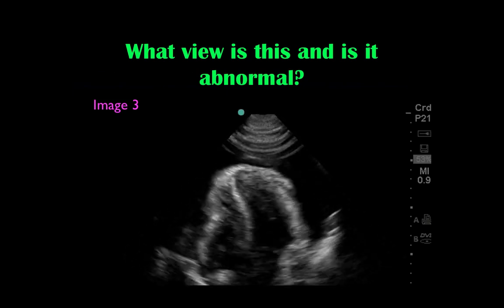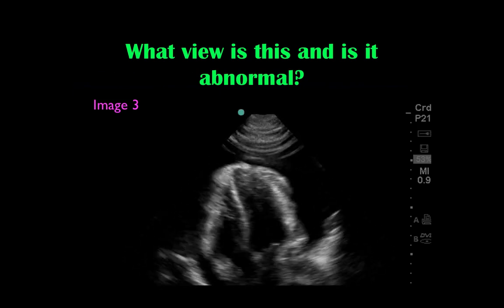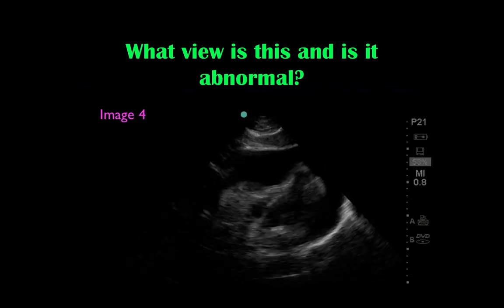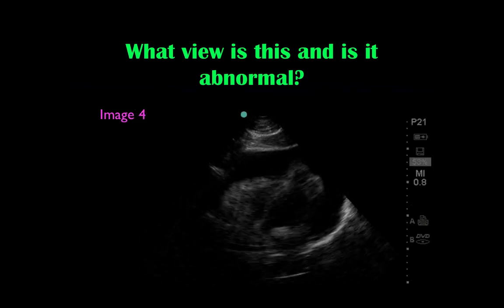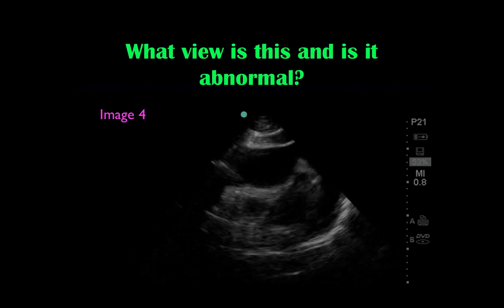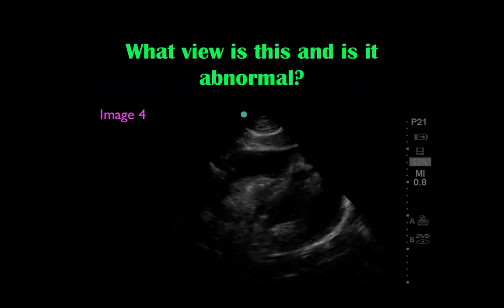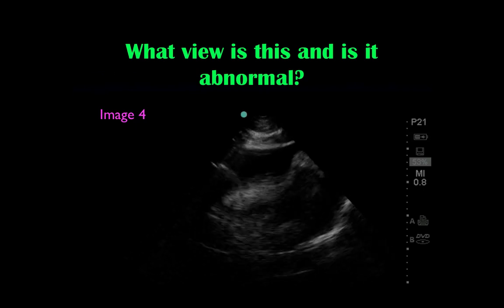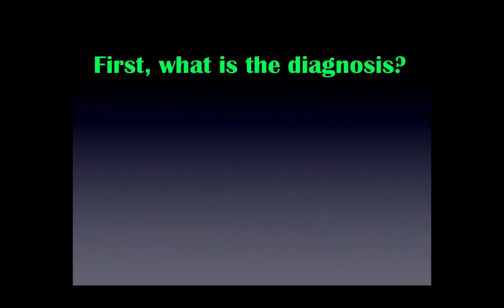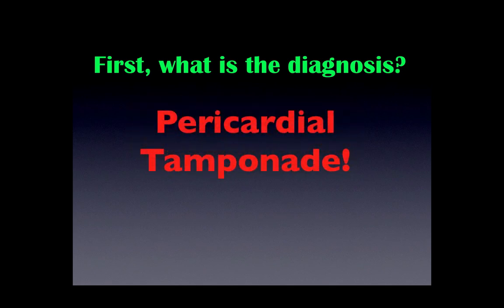And then one last time, we'll take yet a closer look at the heart for a more detailed examination with one more view. Image number 4. And the same question. What view is it? And then, of course, that's followed by the second question, any abnormality? So, did you make the diagnosis? Pericardial tamponade.